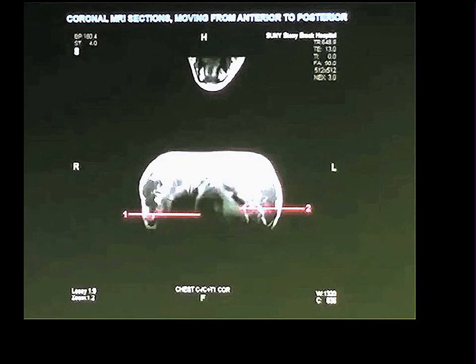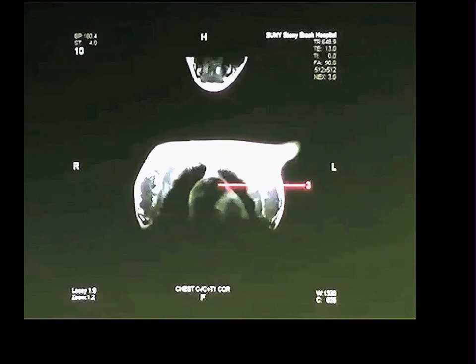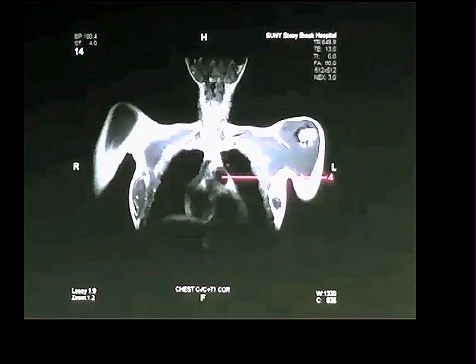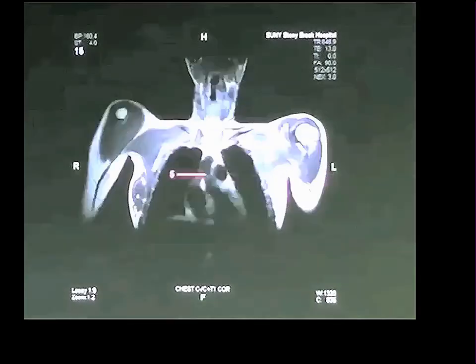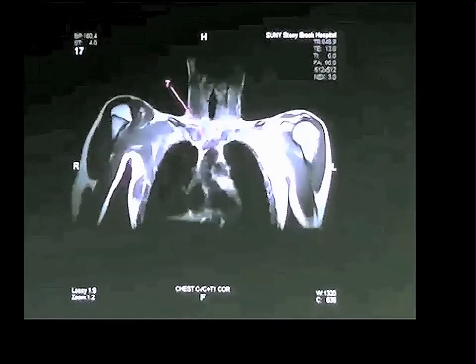It's the one that sits up against the sternum. So when you start in the front and head backwards, you're going to get number one, which is the right ventricle. That's the first thing you're going to see, essentially. And then, in this particular case, we also get a little bit of the left. And we follow number one, and you see it's going to turn into the pulmonary trunk. Number three, the pulmonary trunk. That three is called the pulmonary infundibulum, narrowing the ventricle to enter the pulmonary trunk. Three is the pulmonary trunk, and then it's going to branch into pulmonary arteries.